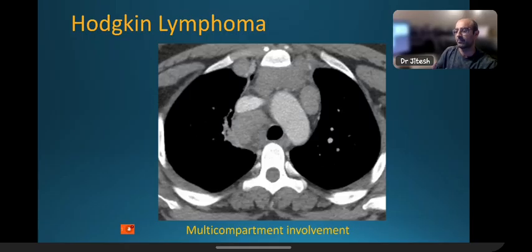But when we have a primary tumor within the mediastinum, then it is not easy. So this was a multi-compartment involvement. It's easy to say that most likely this is a lymphoproliferative disorder or a lymphoma.